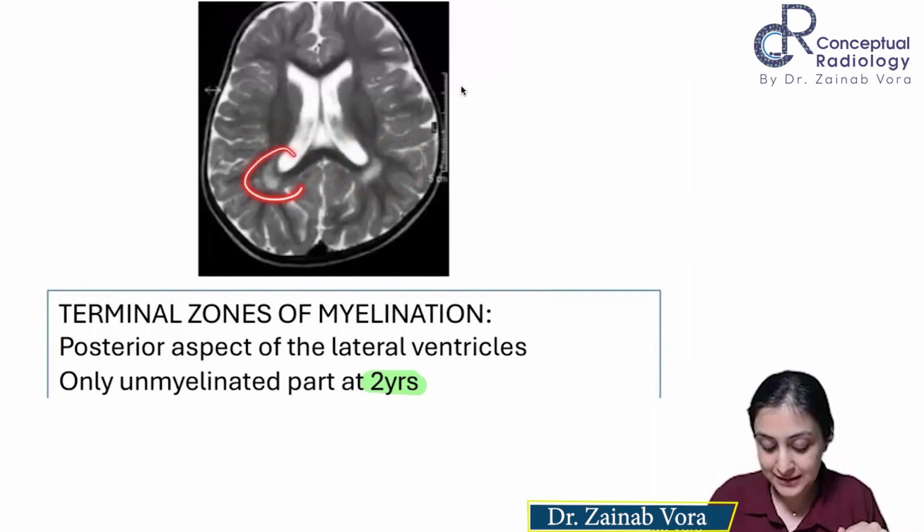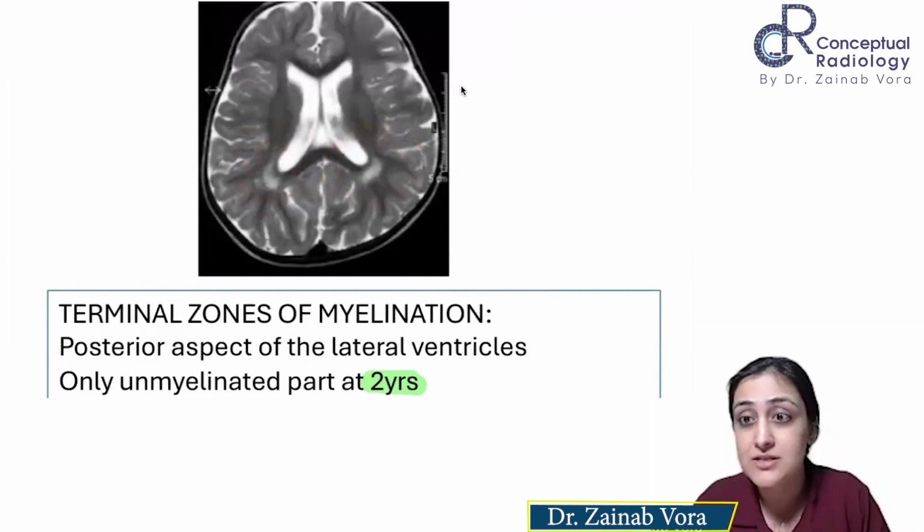Okay, so you can see that this is T2 hyperintense. So I hope you guys understand this.